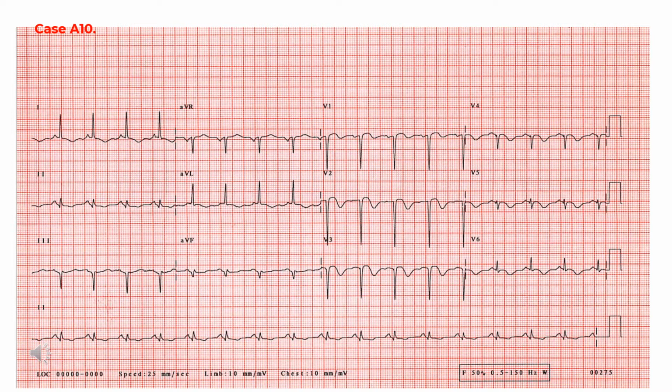Comment. The changes in the anterior leads are those of a fairly recent infarction. The Q waves in the inferior leads date from her previous infarct 4 years earlier, and at this stage the T waves in the inferior leads have resumed their upright position.